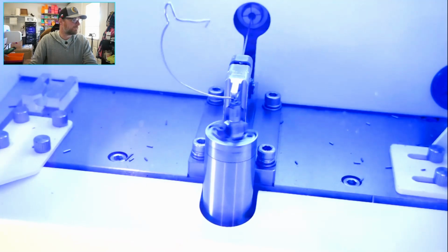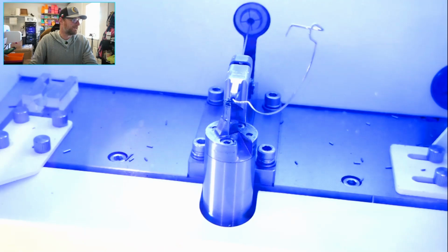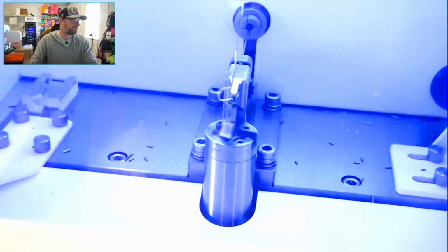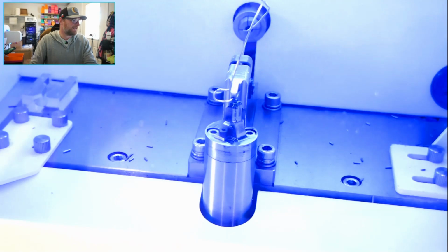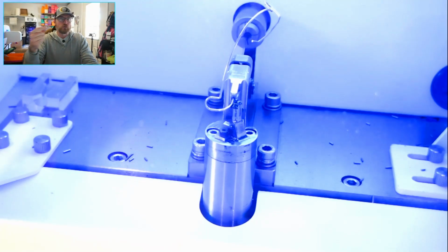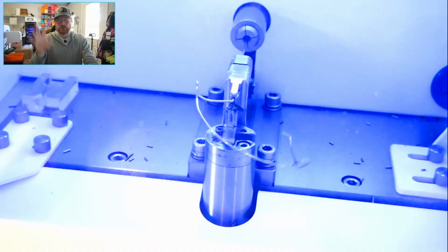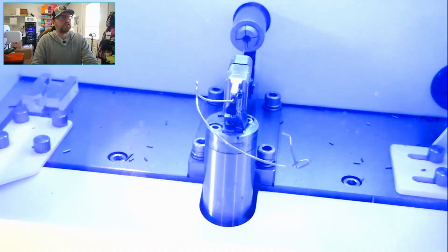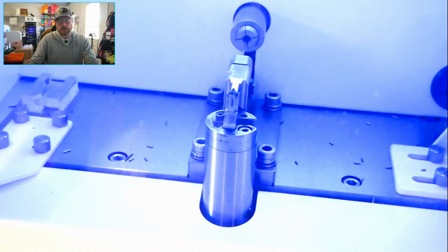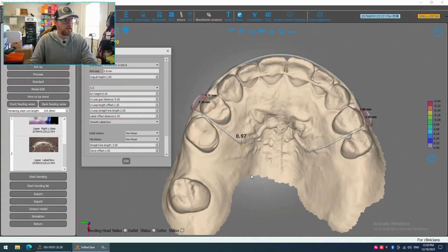Oh my gosh, it's bent the original file. See, I didn't press edit, so it didn't save the bend. That's the original, see where it's turned in? I went straight into bending. So you can pretty much go straight into bending, without even editing or anything. Isn't that crazy? You just check it, it looks good, send it to the bender. But if you do make a change like I did, you need to do OK and then hit edit. If I bend it again, it'll have straight ends.